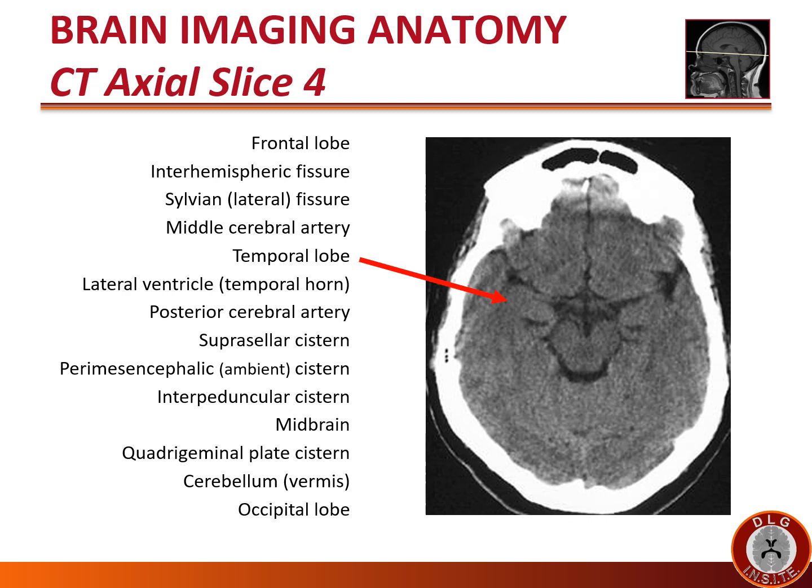At this level, laterally, we see the temporal lobe. Once again, if you see the sylvian fissure on an axial image, just dorsal to it will be the temporal lobe. These small slits of black CSF space in the temporal lobes are the temporal horns of the lateral ventricle. In normal patients, these temporal horns are very small. They only become enlarged with diffuse atrophy of the brain or focal atrophy of the temporal lobe, or when there is compression on one side leading to hydrocephalus on the other side. But normally, the temporal horns are small slits within the temporal lobe.